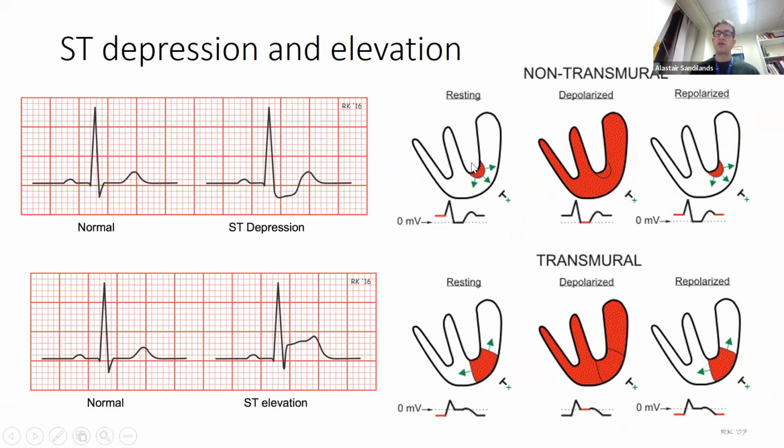In the resting state, the wave of depolarization now is, even in the resting state, because of the ischemia, going towards the recorded lead. So in the initial depolarization of the QRS, the recorded lead here is recording a positive segment. So it's above 0 at the isoelectric line. That's the start. We then get depolarization of the whole of the muscle. So at that point, the recorded lead is not seeing any signal. Okay? So there's a 0 recording at that point in time after the R wave. So this is now recorded at 0 on the ECG.